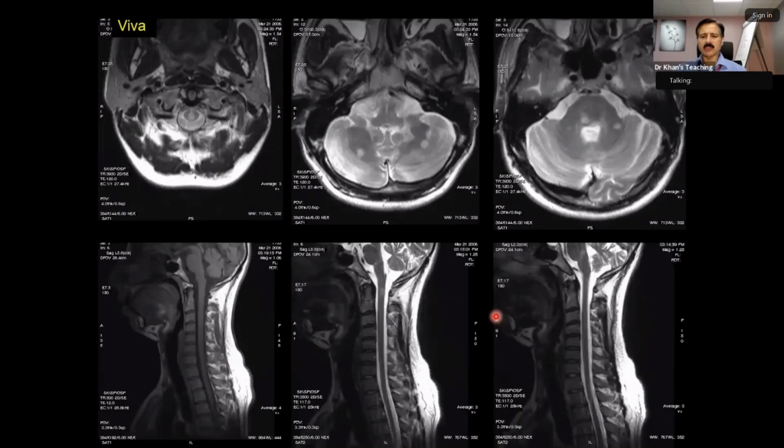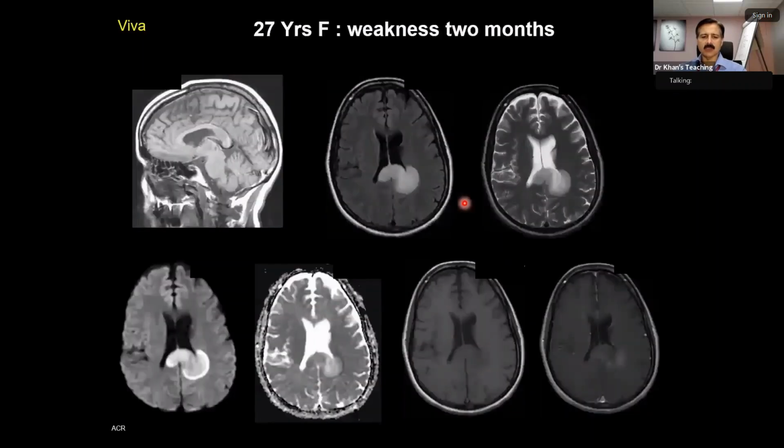Please remember that 10% of patients of MS present with cord lesions, and it is taken as a bad prognostic sign. In the exam, when you see something in the spine, always look at the brain. And if brain is not provided, you tell the examiner, I want to look at the brain. They want you to say that. Remember this. In this particular case, there are lesions there. So already we have got 2 out of the 5 there, dissemination in space. And then you can ask for contrast. You can ask for the rest of the features to diagnose MS.